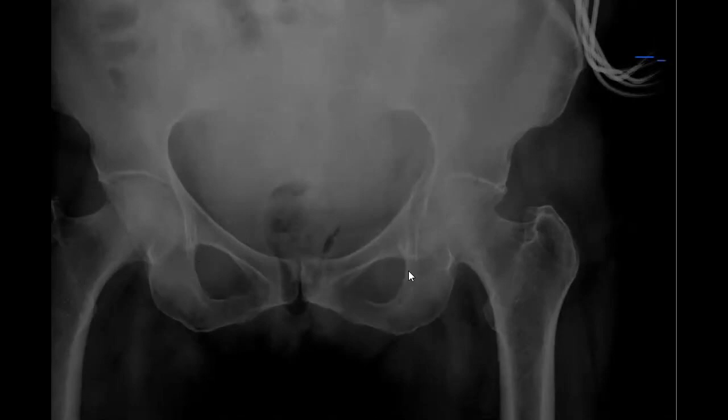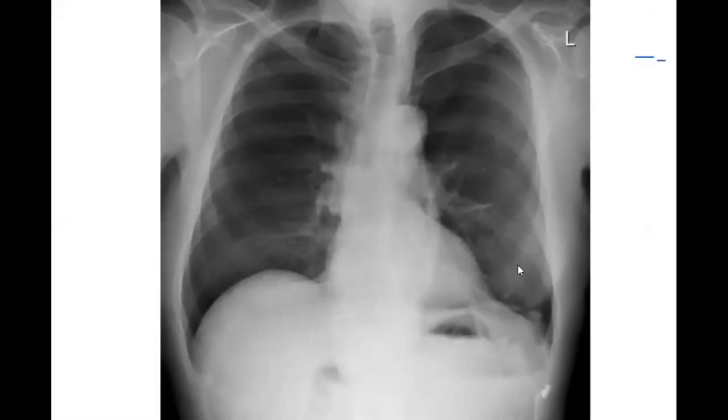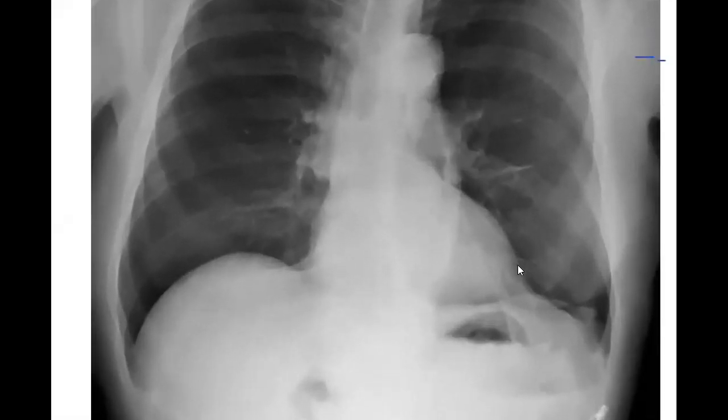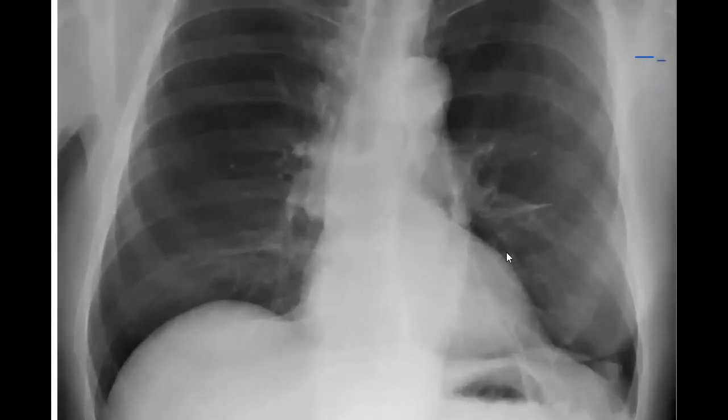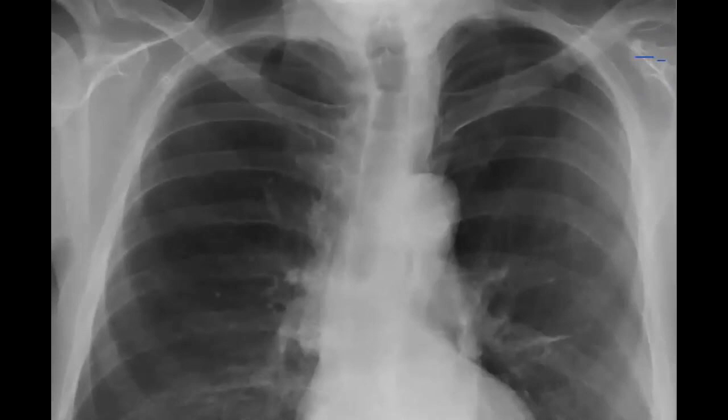This is the ring, and this is the ring, and this is the third ring. Then you are going to check some lines, like this line and this line, and here the same. And if you check this line, you will find something here. So there is a left acetabular fracture. Very common in the exam. In any exam you will enter, you will find this appearance.